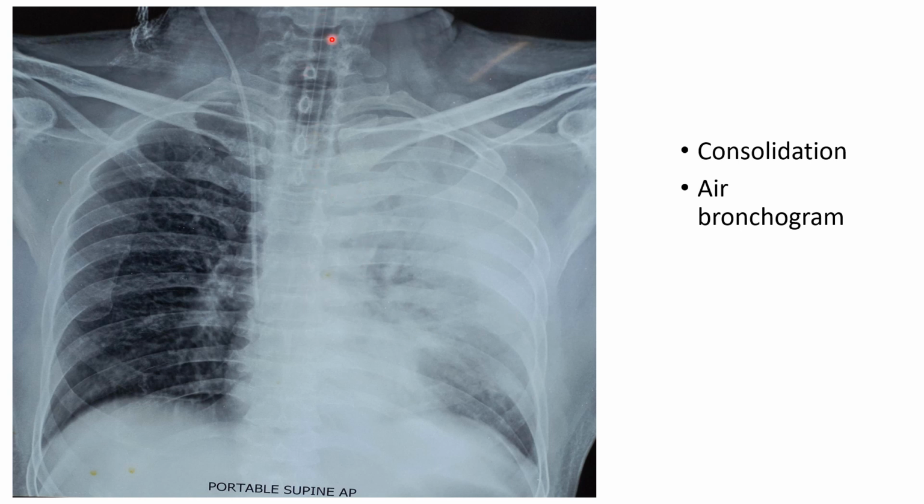The patient is intubated, so you can see the ET tube. This is the central line. We couldn't assess the position of trachea in this case because the ET tube is there and he's on ventilatory support. But normally when there is a consolidation, we don't expect any change in the tracheal position. So in consolidation, the trachea is expected to be in the center. It's a severe pneumonia with severe respiratory failure, hence he is on ventilatory support.